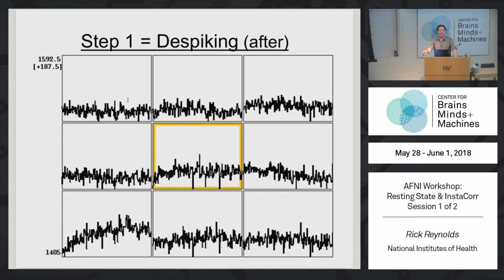So even the volume is still there, right? But then the intensity decreases. It's closer to the trend, but it's still away from the trend. So you still see that there is a difference there, but it's just not quite as impactful. And this isn't a huge thing. We've seen in our analyses that this actually helps a little bit, but this should not make or break your analysis.